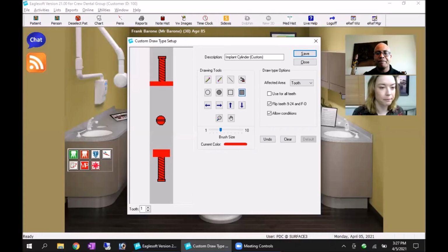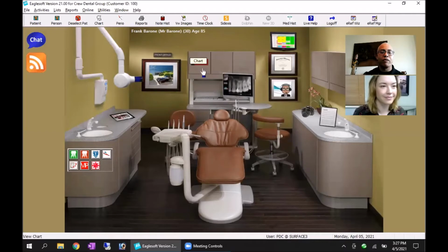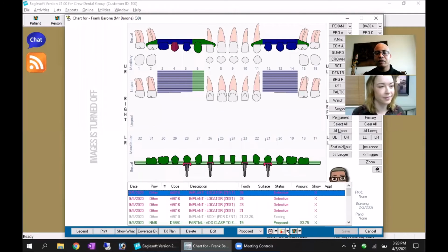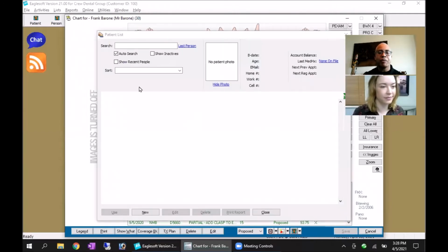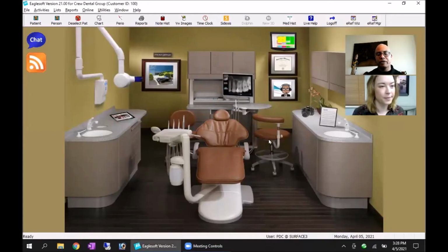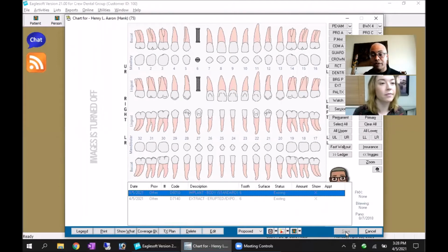That's great. Yep. So, and again, the more you guys can think about this, the more it will help. And no matter what, the more you can add to the level of detail, the better off you're going to be. And just to give you an idea, let me just open up another patient here. Click. And actually, I'll just go back to Hank. Because one of the other things we were talking about is seeing a patient who might have some airway issues.